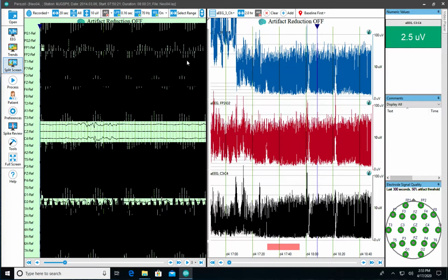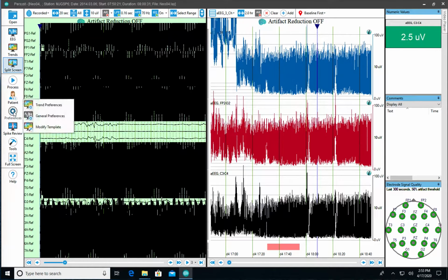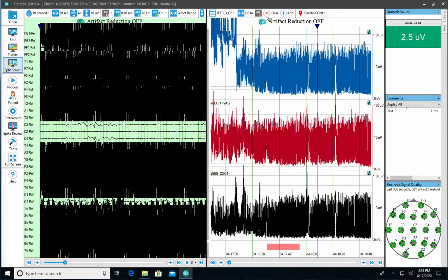So to get started, let's go back to our trending montage. And how do we find out what the trending montage is? We'll go to Preferences and Trend Preferences. And if we go to Channels here, this is the Neo BP and Ref. That's the montage that was used to trend this. And actually, I'm going to clear these trends.